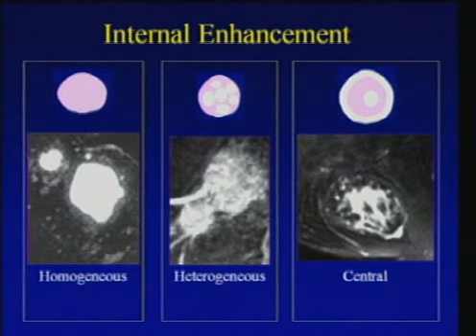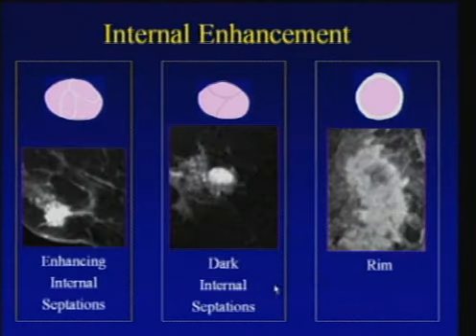Contrast this to this case, where this is what I mean by heterogeneous enhancement. Yes, overall it appears a little bit brighter than normal tissue, and some spots appear whiter, but really there's no distinctive pattern, and actually both of these are metastatic lymph nodes. And that's in contrast to this case. Here you can see the outline of the mass, and in the center it just appears brighter than the periphery, and I'll get more into this mass in my next lecture.